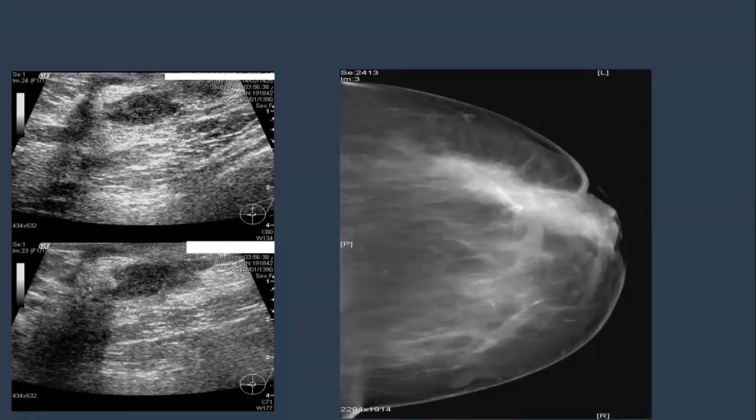So, what if it is not in the breast? If it is in other parts of the body, what could it be? Irregular hypoechoic with posterior enhancement, and we have a tract. If you look here, this is a tract from one of the lesions going toward the areolar skin. This is the nipple, and this is the areolar skin laterally.